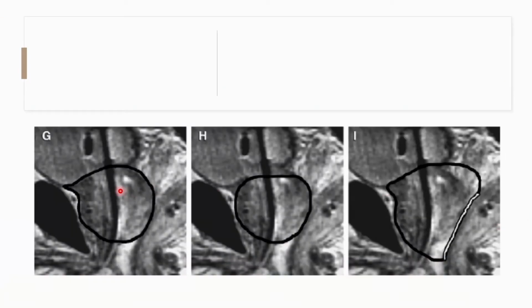Another common mistake is to go too much into the bladder wall anteriorly, because even on a CT scan, it's sometimes quite difficult to identify where the prostate anteriorly ends and the bladder wall begins. So if you go too much into the bladder wall, you're going to unnecessarily treat a part of the bladder when we expand the PTV margin.